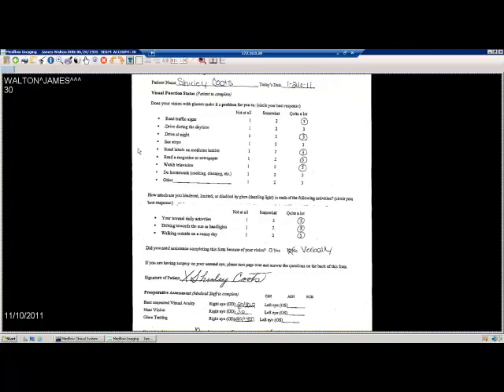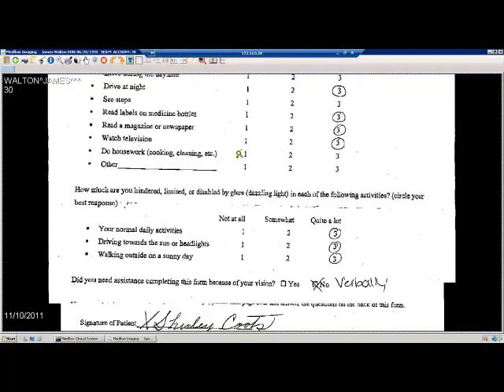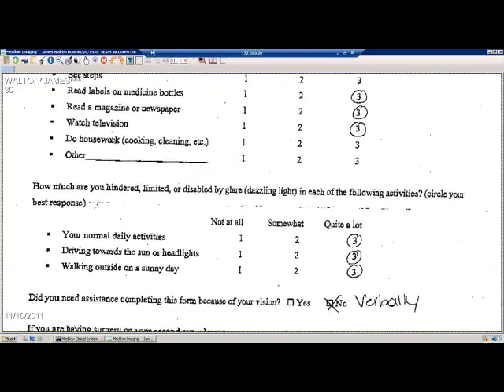If you wish to zoom in on the image, you would select the magnifying glass up at the top with the plus mark in it. Place your cursor on the image. Move your mouse forward or backwards to make the image smaller or larger. If you wish to zoom in on a certain area, you'll select the magnifying glass. Place your left mouse key down to view the wording clearly.